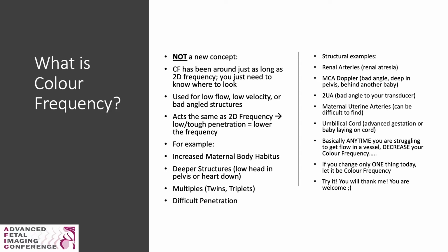We basically use it any time you're struggling to get flow in a vessel. You just need to decrease your color frequency. If you guys can change only one thing today, let it be color frequency. Try it. Trust me. You will thank me. You are welcome.